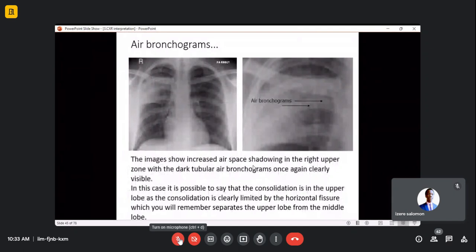So we saw even these images with this chest radiograph. It's a PA, by seeing the location of the scapulae retracted towards the lateral side, and you can see an opacity.